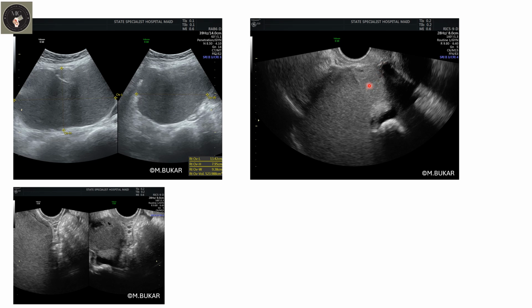Shadowing can also be seen in endometriomas, especially within the walls, called calcific stippling. But occasionally one can also see some form of shadowing in endometrioma. But here, what gives this away is this fat area here, and this area with this intense acoustic shadows. This is what is described as the tip of the iceberg, which is a feature of mature cystic teratoma.